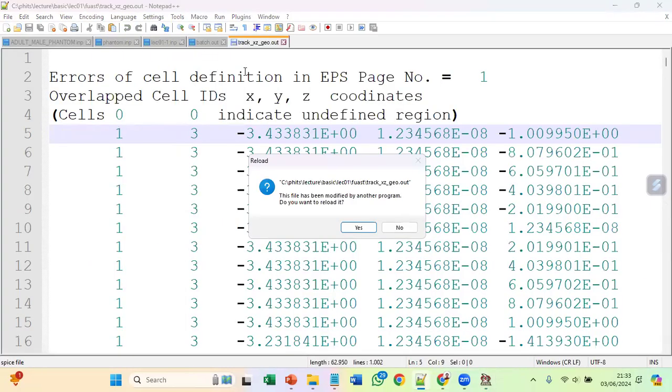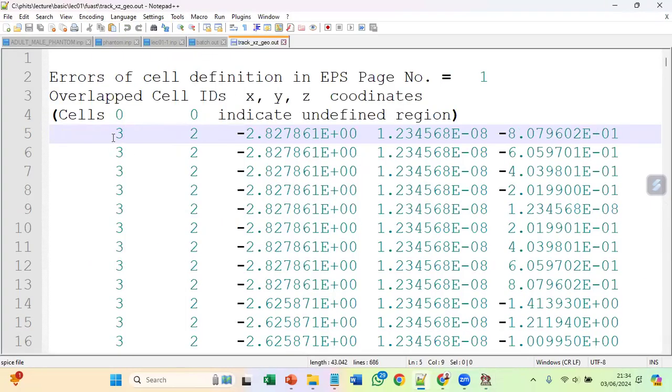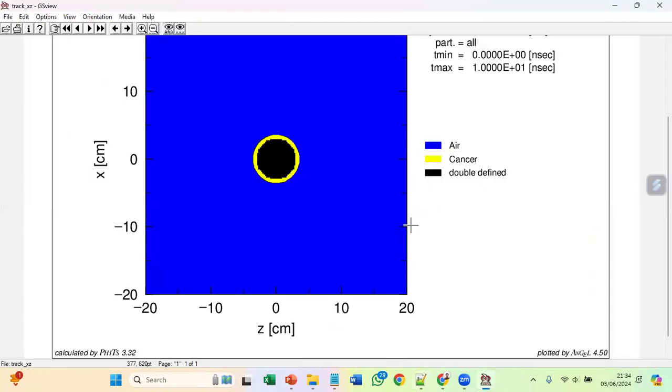We can see the same file. We see that, oh wow, another cells intercept each other. Now cell number 3 and number 2. Yeah, it makes sense, right? Since they are balls with different radii that occupy the same place, some part of the ball will intercept each other.